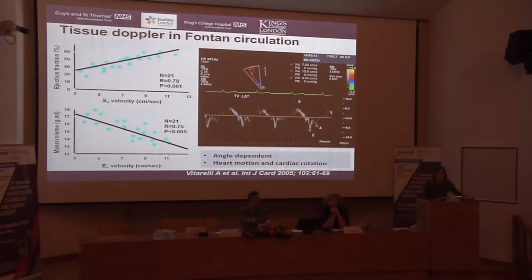But as far as more advanced techniques, tissue Doppler is one of those. So we can assess myocardial systolic and diastolic velocities. This is a nice study published by Vitarelli et al. a long time ago, in 2005.